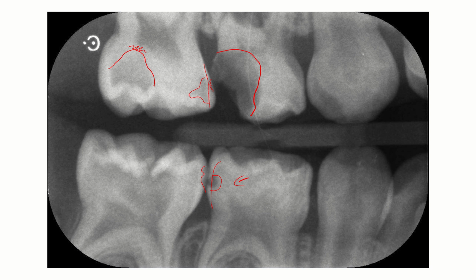The other one is an even bigger lesion, and that is in this 8-5 here. So the lesion starts, that's your sort of entry point through the enamel. However, it is all this area. Now, we cannot tell just from the radiograph, but I suspect, with the benefit of my experience, that what this would look like in the mouth would be very chalky looking on the surface, very opaque looking.